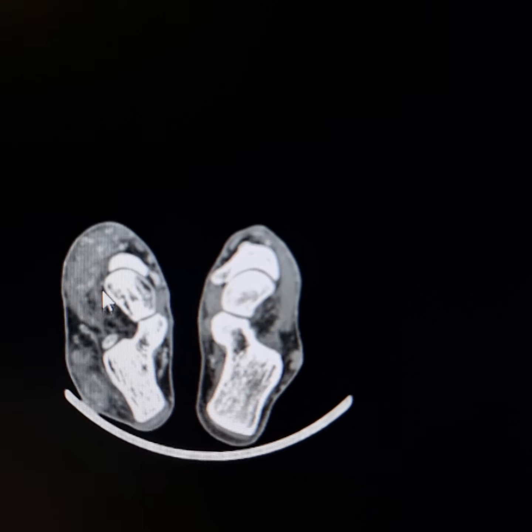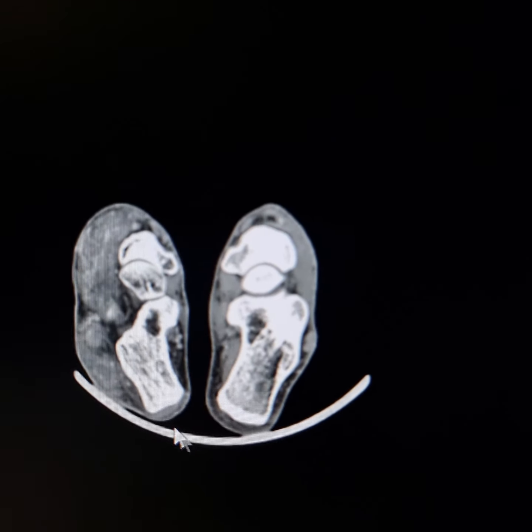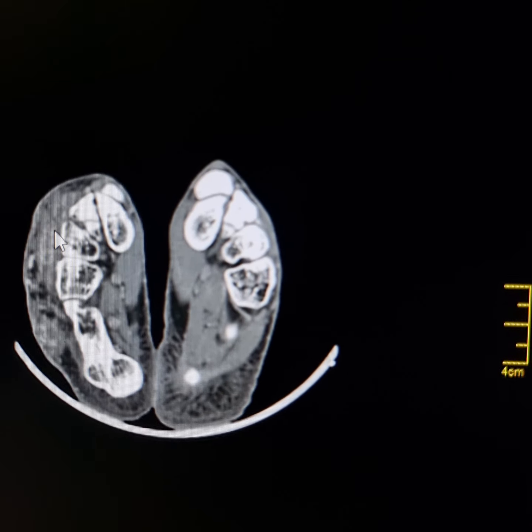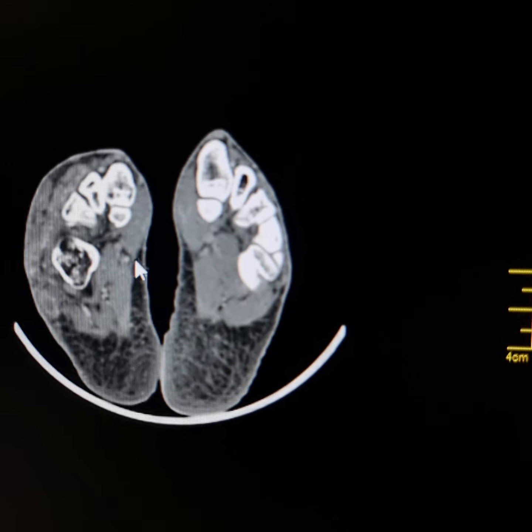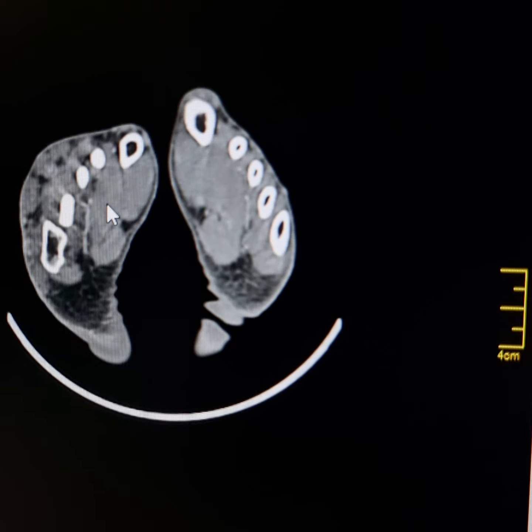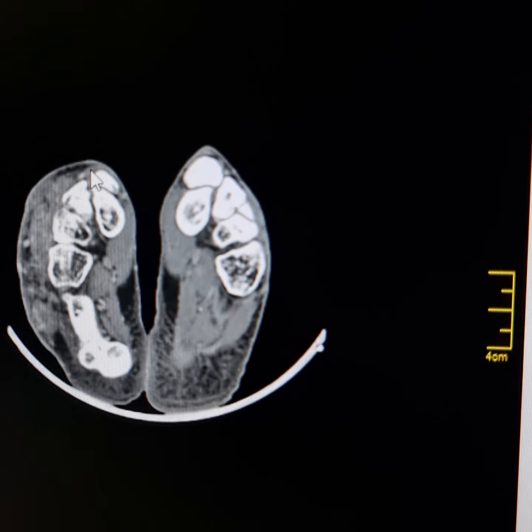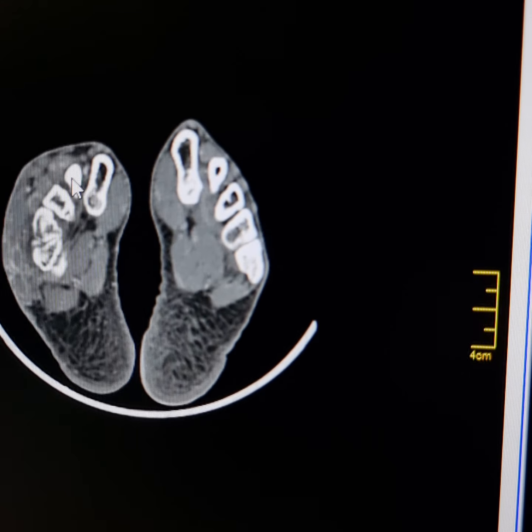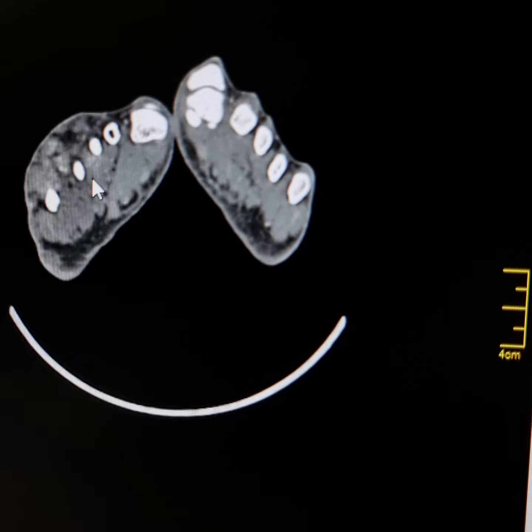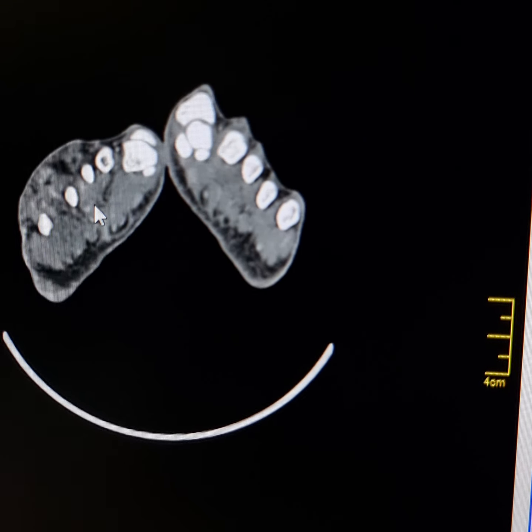Now this venous angioma, it extends downwards along the dorsum of the foot. Here it has involved the extensor digitorum brevis muscle, peroneus brevis muscle, and extends downwards in this region. It is mainly fed from the branches of the dorsalis pedis artery. In these interosseous spaces, you can see that this venous hemangioma extends into the anterior part of the sole of the foot as well.